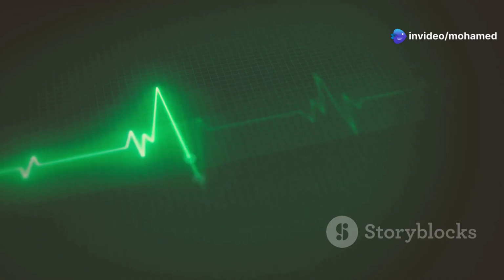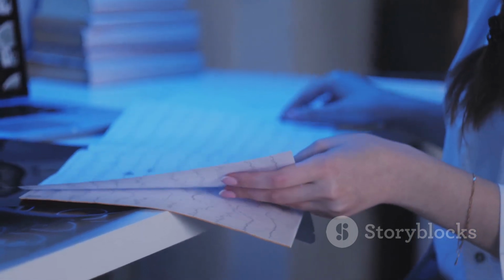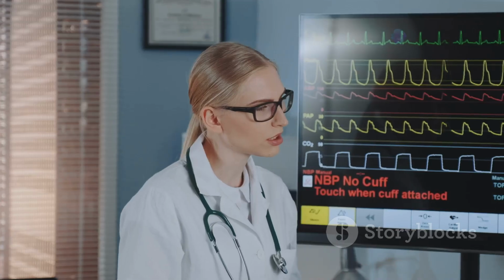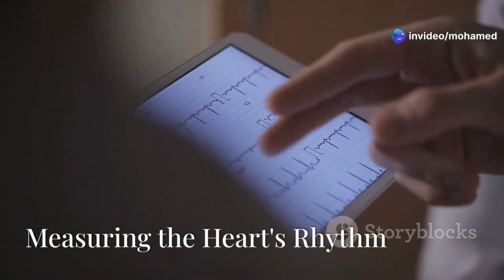Its shape and direction are important. They can be affected by various factors such as electrolyte imbalances. Changes in the T wave can indicate myocardial ischemia or other cardiac conditions. It's essential to analyze its morphology for a complete cardiac assessment.